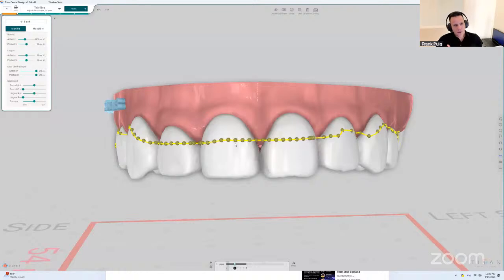But we want it to be as easy as possible. So we want the default values to be most likely what you need, and you just need to tweak a few things. So play with this. Let me know what you think. And if there is any setting that you want to adjust or add, please let me know. This is the moment to contribute to Titan and get the software exactly the way that you want it. Hope this helps.